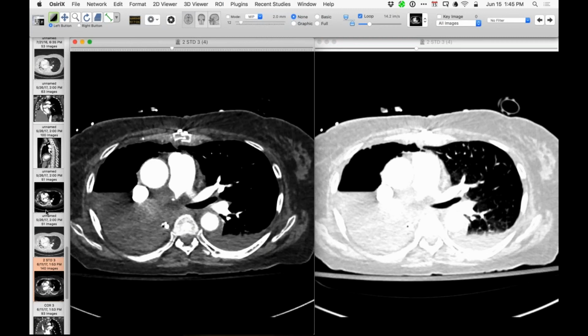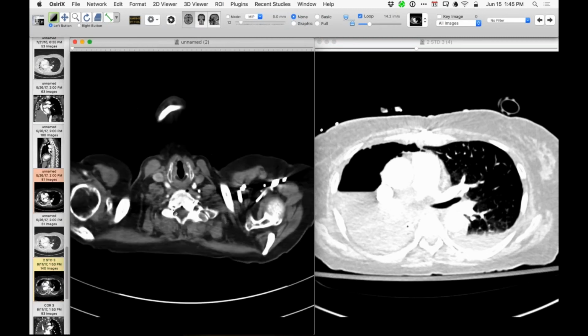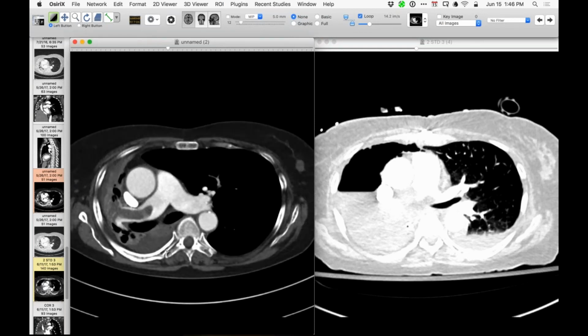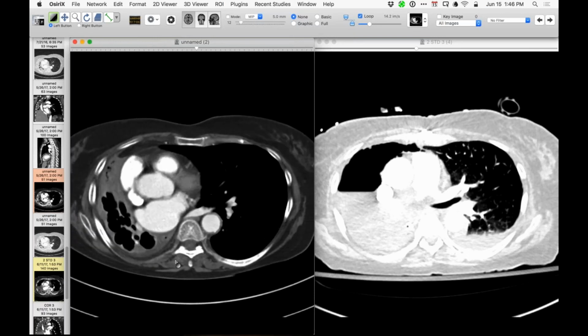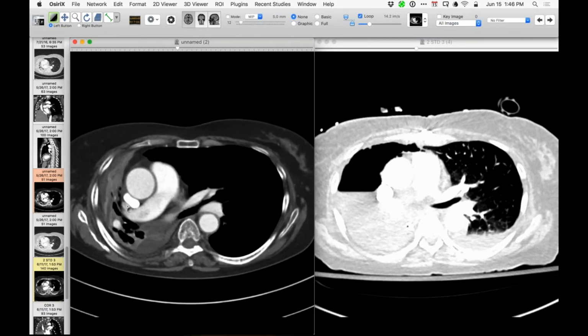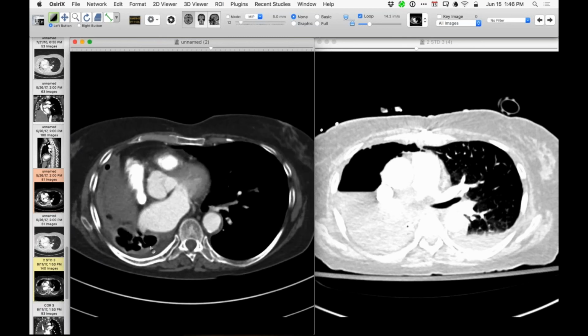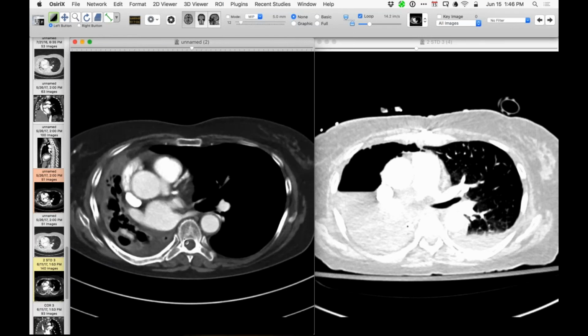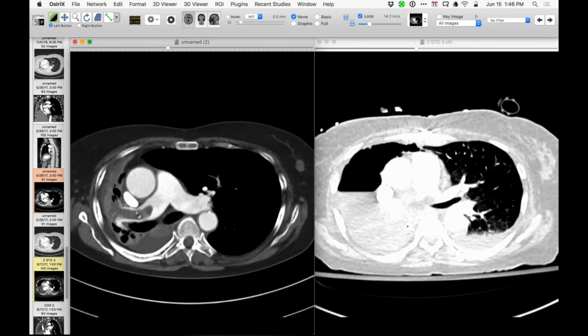So it might have been this guy. Of in situ thrombosis in this kind of context? Howard, it's interesting, on that scan there, if you go down, it looked like the pulmonary venous return was pretty robust on that side. Usually we see it's still coming in. Usually we see that sluggish flow. Yeah, here's superior and inferior. There's still blood flow going through that lung right there. Yeah, it's true. You get some sort of smoke there, but it's going around.